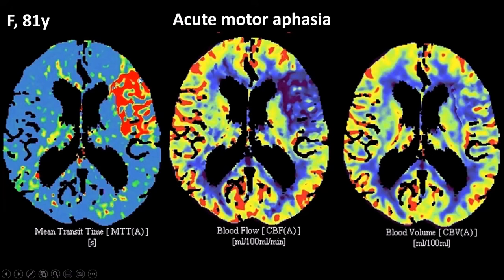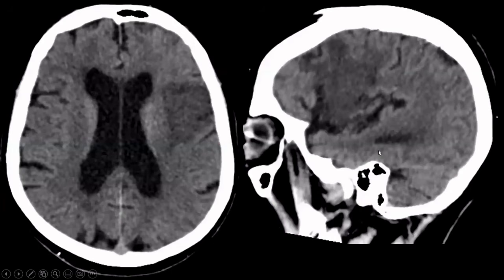So we see an infarction in the frontal lobe. This is the area of the frontal operculum. And does that answer our question? Is it located in the Broca area? Probably, yeah, if you look at these images, but we really want to confirm this, of course. Let's look at axial images.